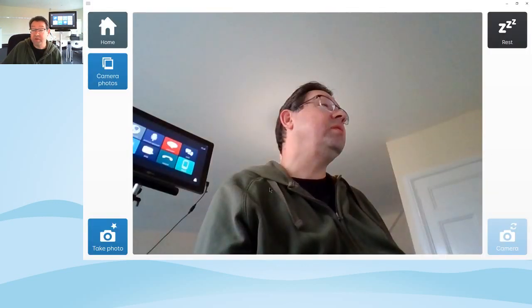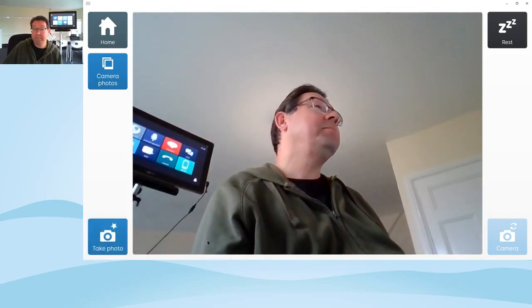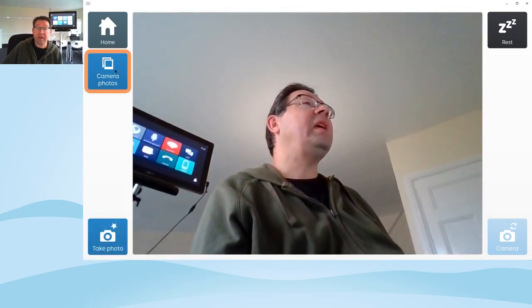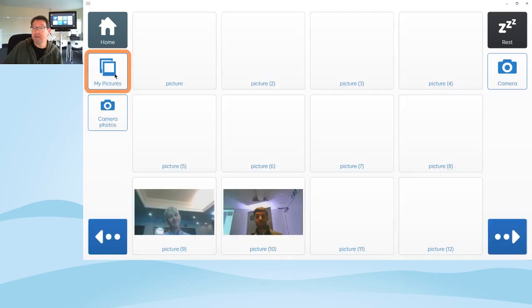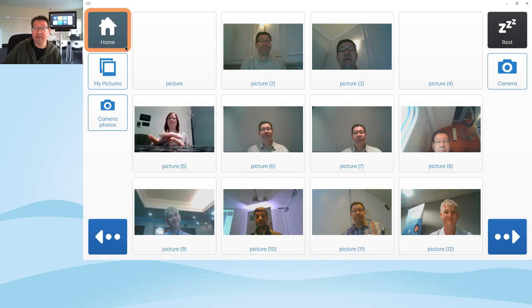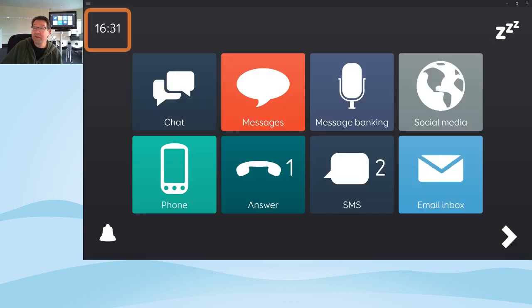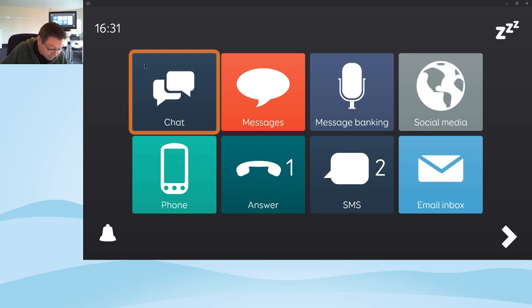It's possible to view and take pictures, so let's do that. Let's take one. There we go. And you can view photos here. You can see we've done this sort of thing quite a lot before. So you can take and view and email photos.